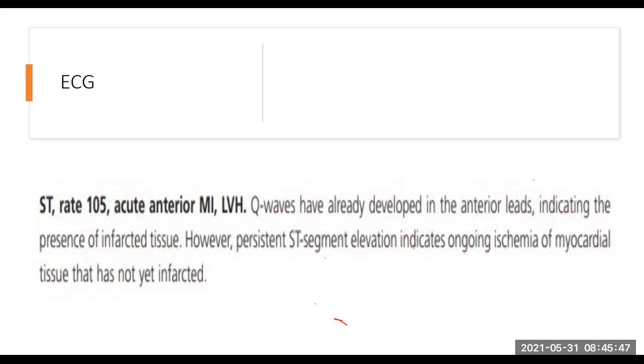Now, and then of course you just get the odd ones, right? Where there's just no reciprocal changes for whatever reason, all right? In this case, it can also be down to the left ventricular hypertrophy, simply because of the size of the left ventricle. The area that may be infarcted may not be large enough to show on the other side. So these are just some of the reasons. The reason why I went into the differentials is because you need to know them, all right?